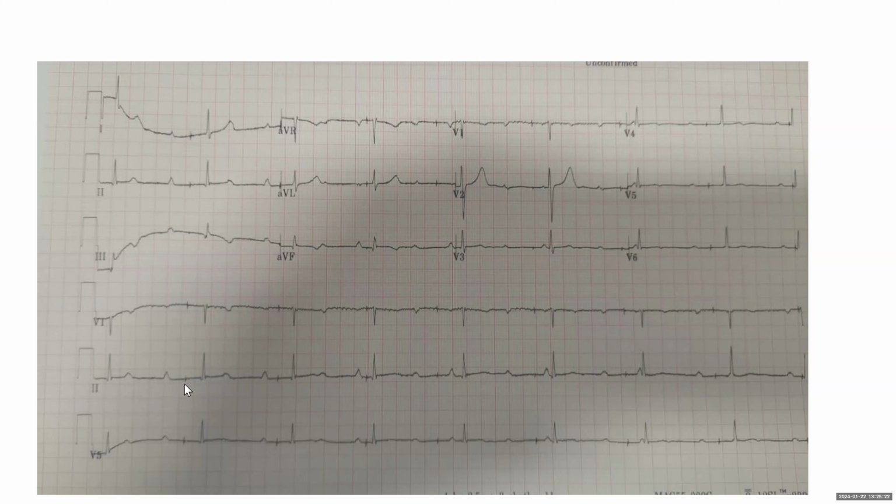And then you see spikes, but you don't see capture. So this is failure to capture because you see a spike not followed by any electrical activity, not P, not QRS. This is, you know, that there's failure to capture. There's also failure to sense because it comes in a fixed interval. These QRSs are not changing the rate. Question, failure to capture V or A?